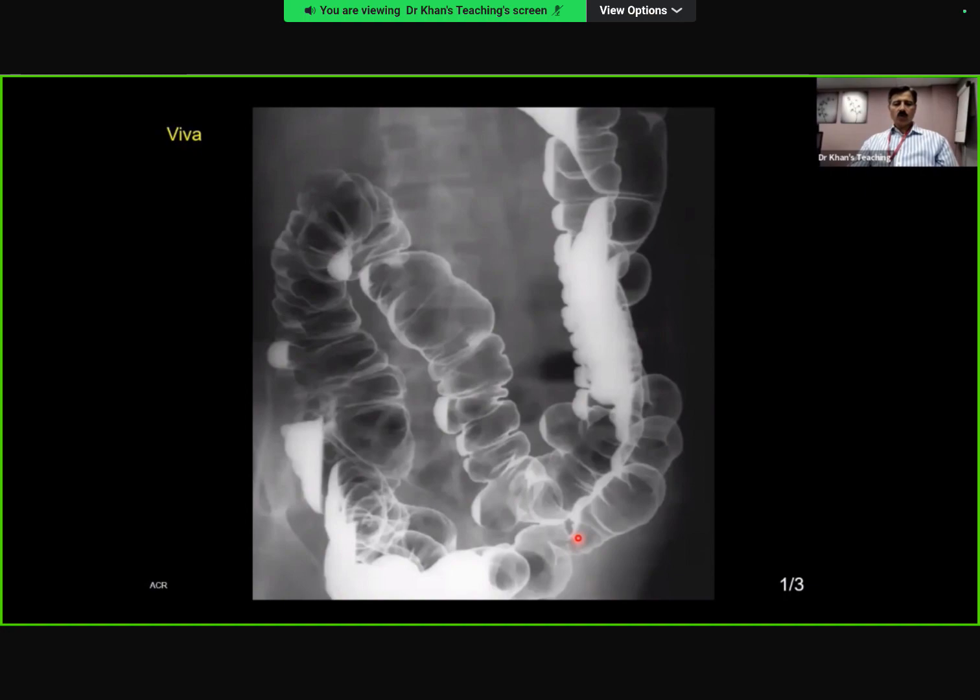Something else. You see, look at them, they're quite wide-necked. They're quite big. Okay, let me give you a hint. This patient is under the care of the rheumatologist. So whether these are inflammatory.